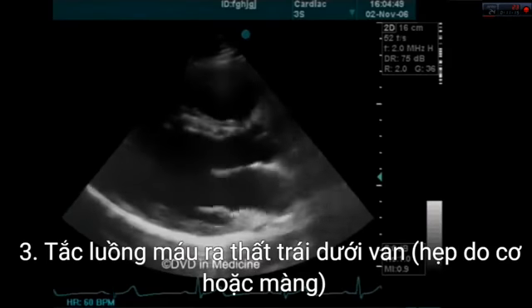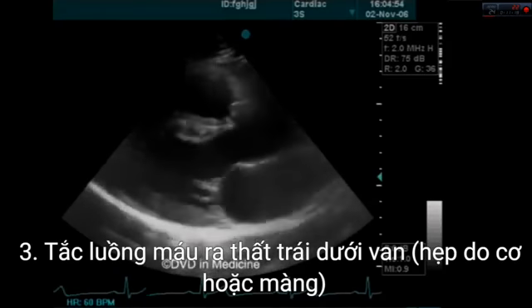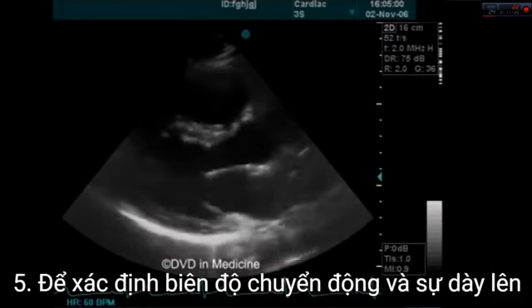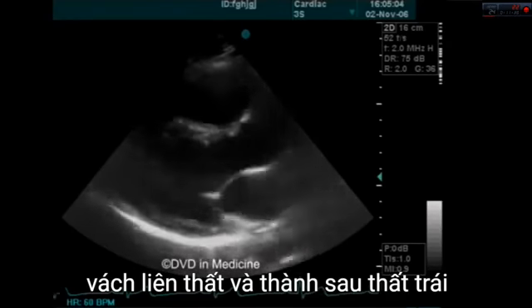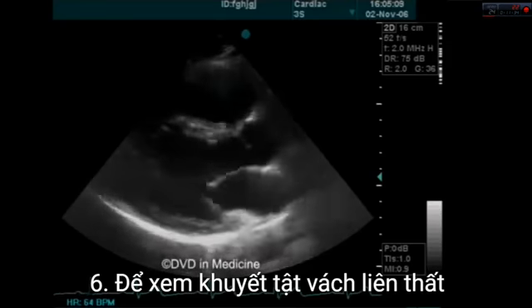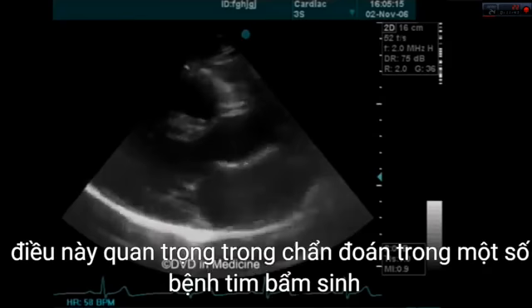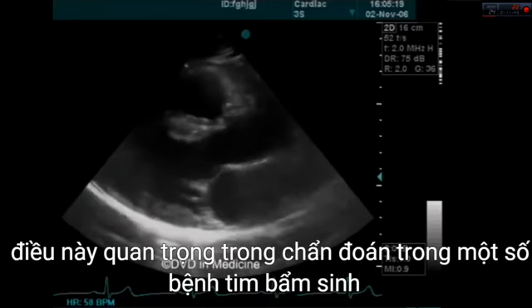3. To diagnose subvalvular left ventricular outflow tract obstruction, membranous or muscular stenosis. 4. To assess left ventricular systolic function. 5. To determine the amplitude of motion and thickness of the interventricular septum and posterior left ventricular wall. 6. To see membranous defects of the interventricular septum. 7. To confirm mitral aortic fibrous continuance. This is important in the diagnosis of some congenital heart diseases.